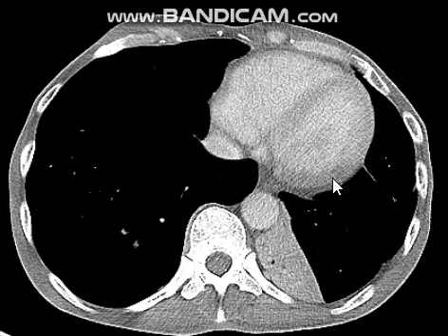Why? Because the superior segment will disappear when the heart appears. So the superior segment should be disappeared now as the heart appears. So these are the basal segments. There is collapse here of the left lower lung lobe basal segments.